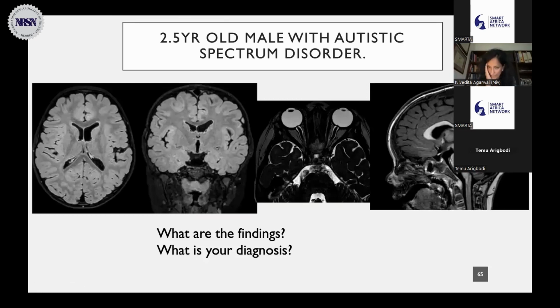So this is your example, and probably now you'll be able to see the protrusion of the optic nerves and the dilation of the optic sheaths. Okay, this is such an important marker. And when it's a child, you'd have no idea if the child has headaches. You have no idea if the child has visual loss. So this child went into an ophthalmological examination, found retinal hemorrhages.